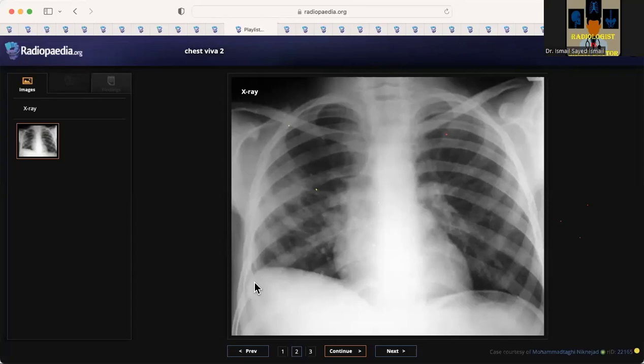So what's different about this hemidiaphragm? It's elevated. Is there anything in specific to point towards how you can differentiate it from just an elevated hemidiaphragm? Yes, because there is lateralization of the dome of the hemidiaphragm. So this is subpulmonic. Well done. You've picked up the abnormality nicely, and you've given the appropriate differential, which you said infection. And then I've asked you about the effusion. So this is a subpulmonic effusion, and as you said, it's lateralization of the diaphragm.